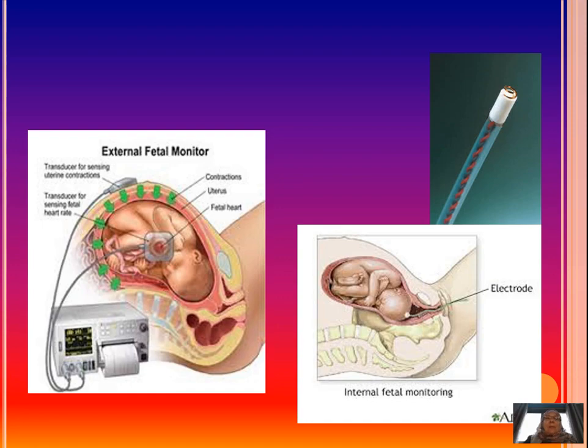During labor, it might be that the mother moves a lot, so that the heartbeat is lost quite a lot of the times. But you, as a doctor, want a continuous CTG monitoring. Then it is possible to use a fetal scalp electrode, which you see on the two pictures on the right. It allows, with a little screw, to monitor the fetal heartbeat directly from the fetal scalp, and allows a monitoring picture without loss due to movements or contact of the CTG probe to the fetal heartbeat. So this is just to make you see that this is possible.